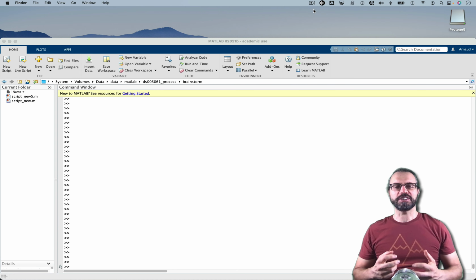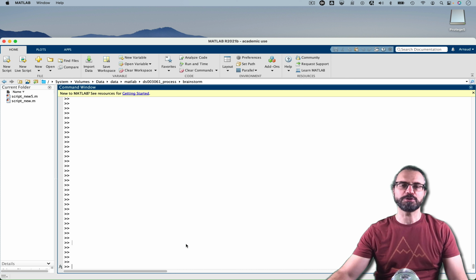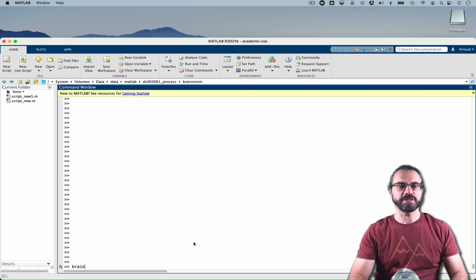And so let's get started. Let's get started with Brainstorm. So I went online, downloaded Brainstorm, installed it on my computer, and added it to the path. And now I'm just going to type Brainstorm.